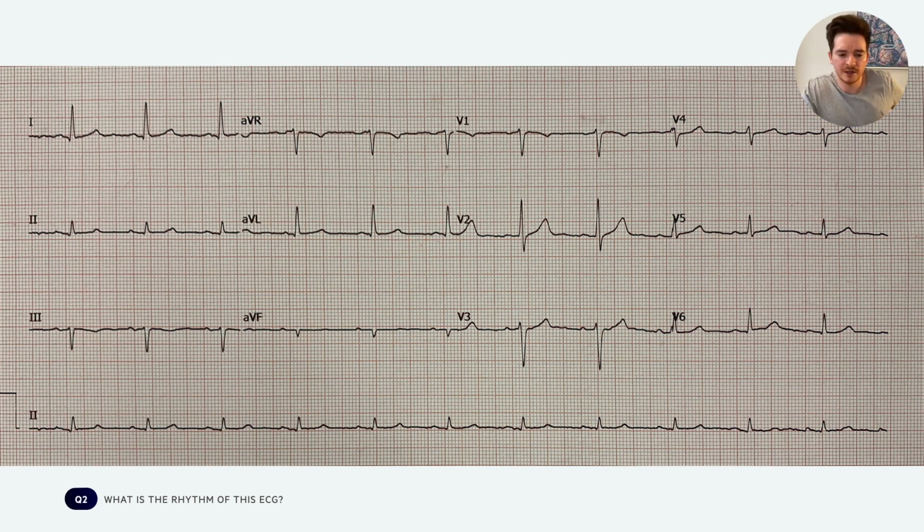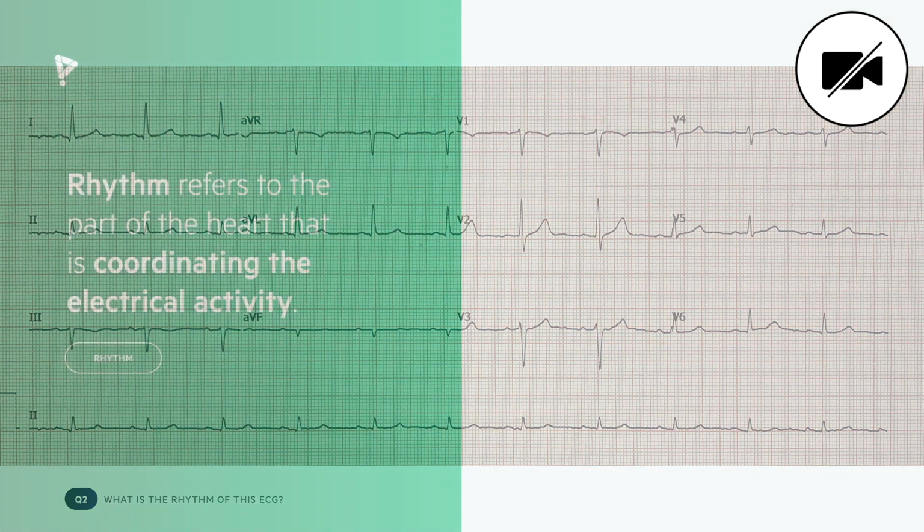So most people are saying it's normal sinus rhythm. And that'll be absolutely right. So for those who don't know why it's normal sinus rhythm, let's work through why and what that means.